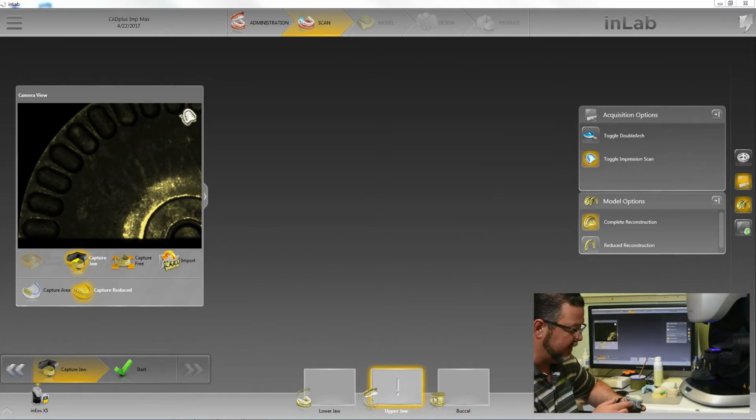Now this is a polyvinyl impression done in a Wagner tray. The Wagner trays are customizable chairside. So the doctor can take the final impression on the very first visit, which will save them time down the road and make it easier on us. And of course, the key to any successful case is a good impression.